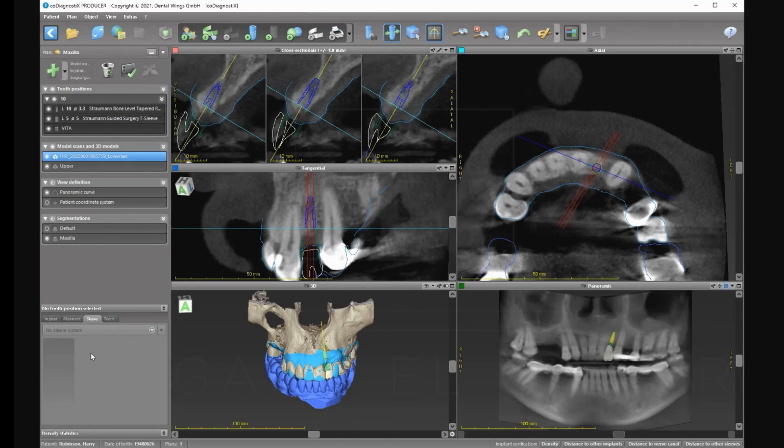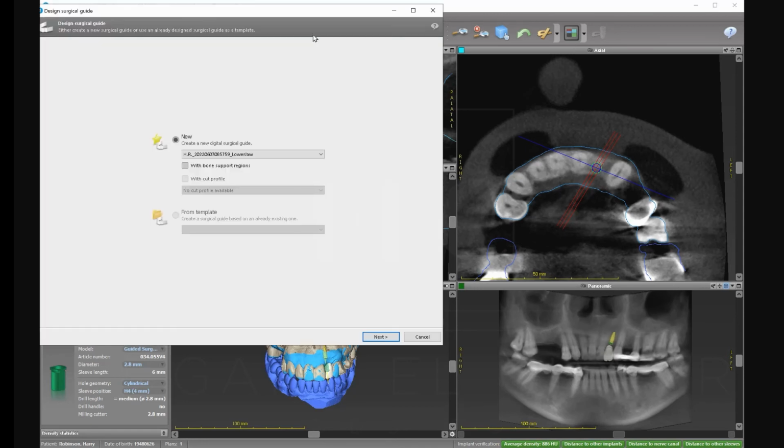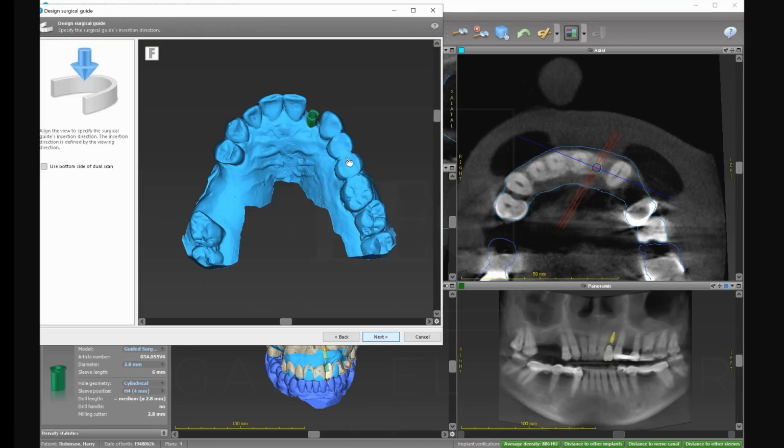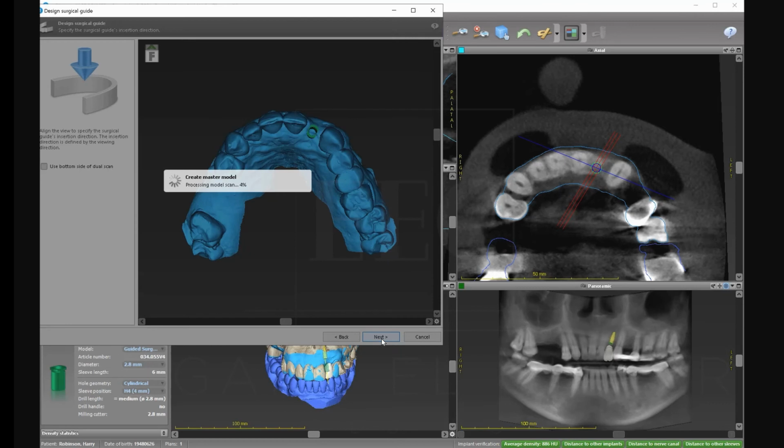And I'm going to go back to the sleeve and implant. I'm going back to the sleeve and I'm going to make it 2.8, because it's impossible to have a guide that is correct, and here it gives me only 4 millimeter. That's okay. I go back to this and upper, and then back to this. You can see now I have more space. A huge difference, but it gives me exactly this if I am lined up properly. And I go like this.